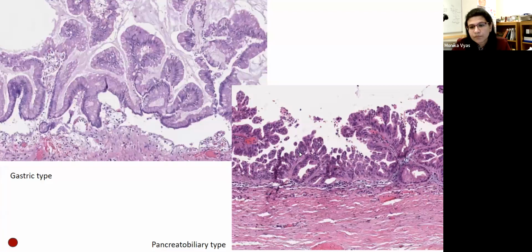Because of this tufting and atypia, in certain profiles you can also appreciate that the nuclei are not polarized, so they're scattered anywhere in the cell. In some places they are present more centrally, or in some areas touching the luminal border on the top, whereas in some areas they are basal, so they have lost polarity.